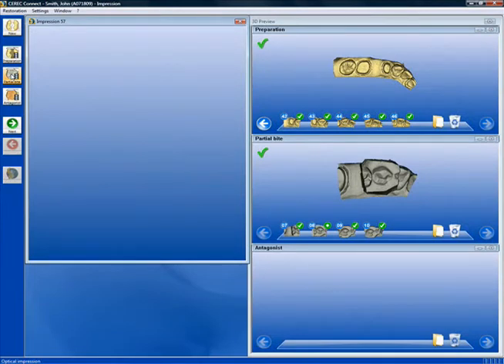In the 3D preview, you can see that in the image area of the partial bite, both the mesial and distal neighbor of the preparation model were captured. This ensures that the partial bite can be correlated to the preparation model.